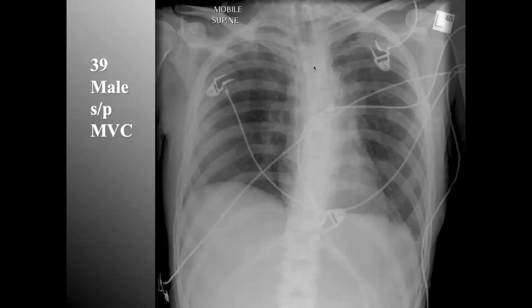B for bones, this is where the abnormality comes in. So I'm looking at the spine, I'm looking at the ribs, and what I'll immediately note here, and feel free, throw it in the chat if you feel inclined, you'll notice there's a little offset to the spine itself. And unfortunately, with this patient, what you have here, if I can get it to come up, you got a fracture dislocation at T5 to T6.